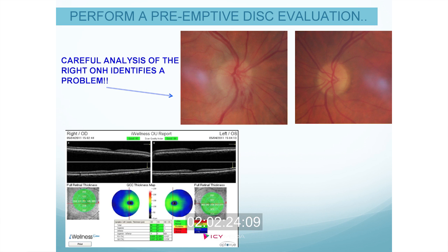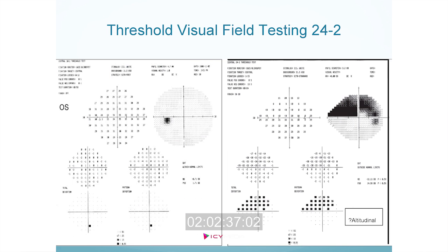And again, look at your OCT on the bottom. They really don't correlate, right? But again, the thought process here is it's such an acute attack, or we just caught it, that it hasn't yet manifested on the OCT. What about getting a visual field, right? We want to see if there's been any functional damage. We know that structurally, nothing has happened yet because the OCT was fine. What about functionally? Has anything manifested?